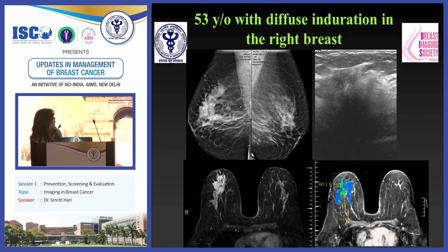Another patient where mammography and ultrasound are not very good in assessing the complete extent, but the MRI is beautifully showing us the extent of disease.